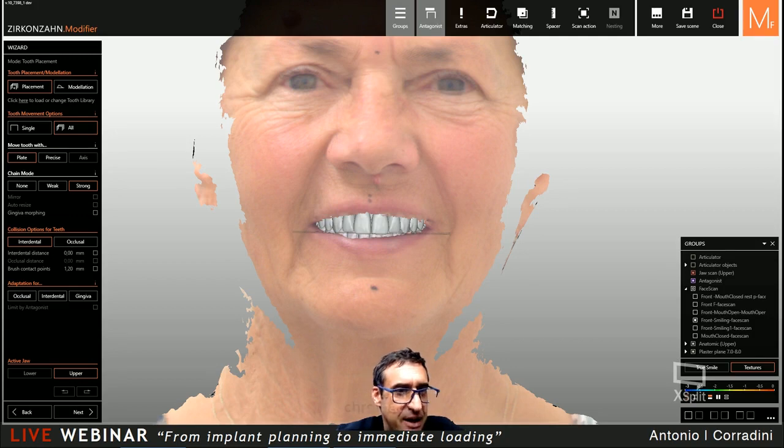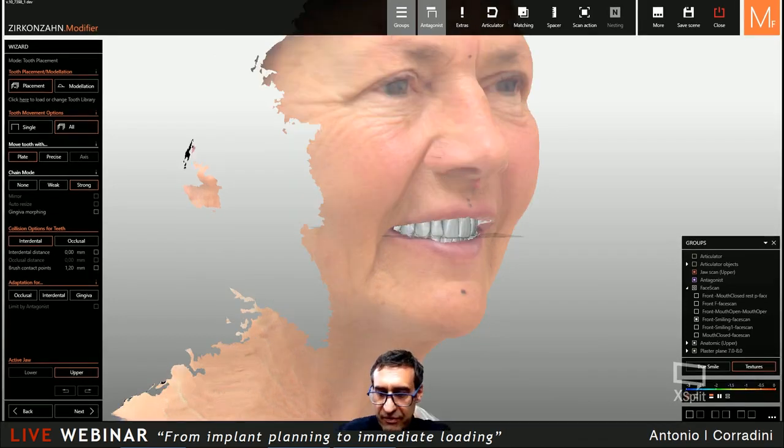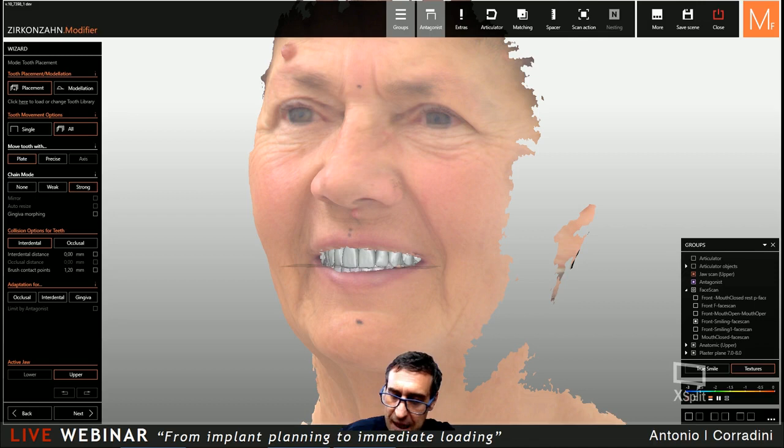Let's say we have different possibilities. The anatomies are really intelligent. Everything is connected, also upper and lower. We can decide, for example, how to cut upper and lower, different percentages, upper and lower, etc. That helps us a lot as technicians, to say. So we can adjust the anatomies.